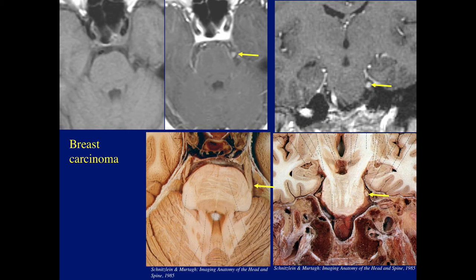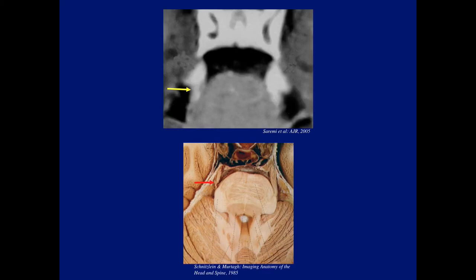Now, sometimes you will see enhancement of the trigeminal in metastatic disease, as Nate mentioned early on in this talk. This was a breast CA. That was the only real finding, the involvement of the left trigeminal. There were no other brain lesions that we could see. What are these markedly enlarged trigeminal nerves? What's the etiology here, which has not been mentioned so far today?